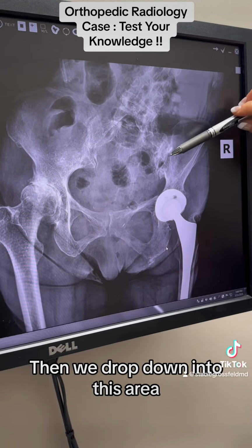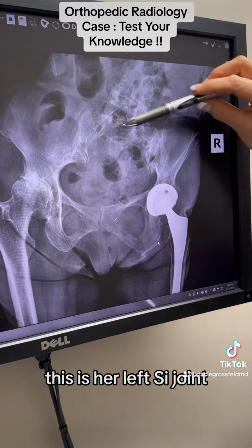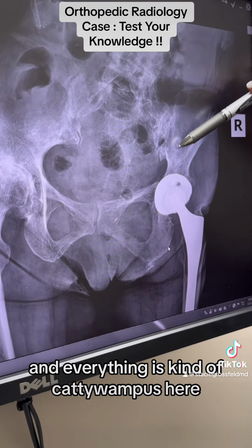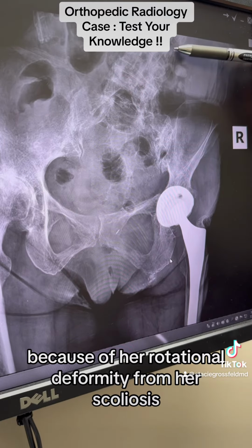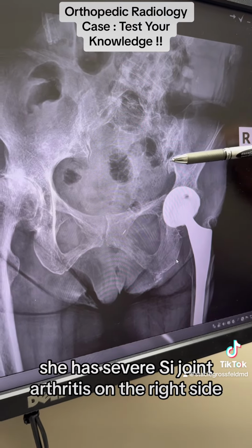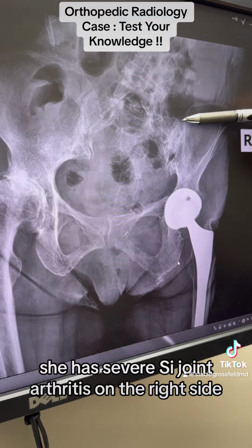Then we drop down into this area. This is her right SI joint. This is her left SI joint. And everything is kind of cattywampus here because of her rotational deformity from her scoliosis. She has severe SI joint arthritis on the right side.